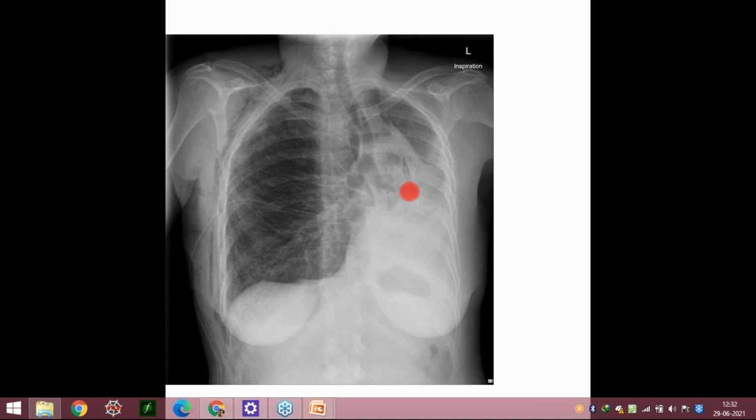They could be post-infection sequelae, post pneumonia sequelae. Then the common thing that we are now facing for the last 1.5 years is COVID. So that could also lead to such kind of a picture. Obviously, this is something which has been taken beforehand. So those could be the possible etiologies.